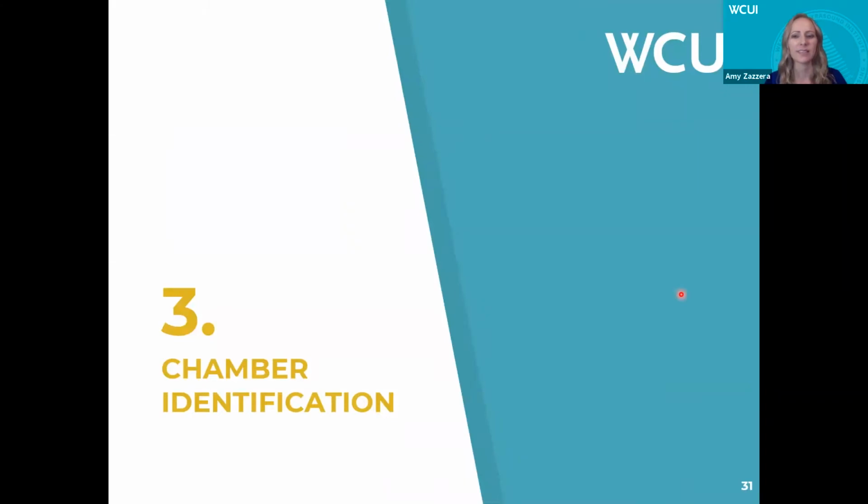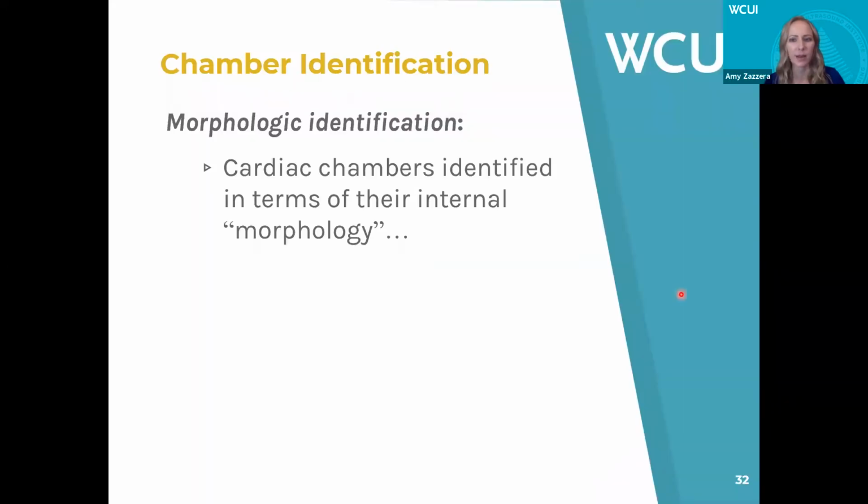So now we discuss the different approaches to imaging the four chambers, so the apical and the subcostal.